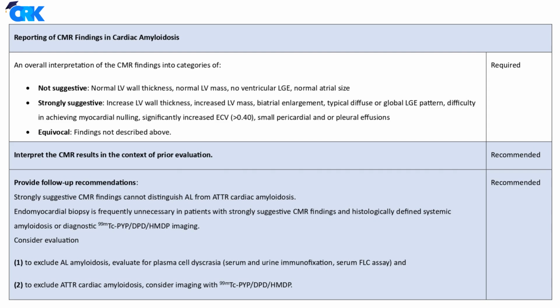Now that you've gathered and evaluated all the CMR parameters, from LV function and morphology to LGE patterns, signal suppression, and T1 mapping, your next step is to summarize and categorize your findings into a clear diagnostic interpretation. Overall interpretation of CMR findings.